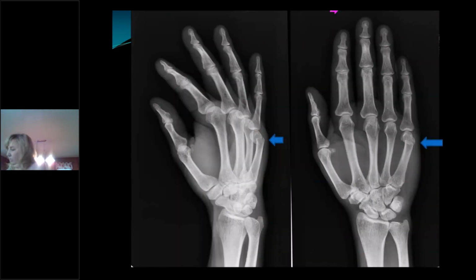Here's another one, just a lot of angulation. Sometimes we'll actually try to reduce these, put them in a short arm cast. Sometimes there's some other types of splints that can be utilized. Certainly no emergency, but maybe put them in an ulnar gutter if you got to buy them a little time, and then send them off to your friendly neighborhood hand or orthopedic person.